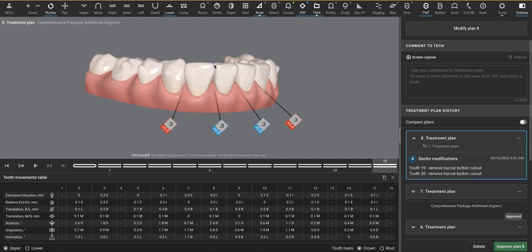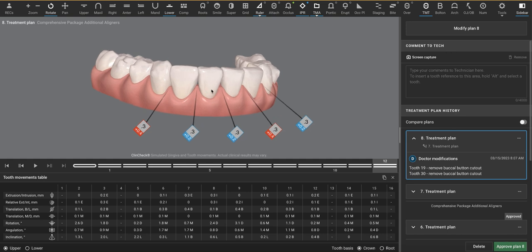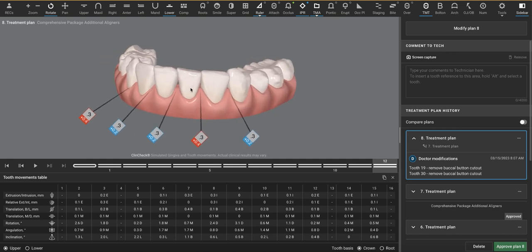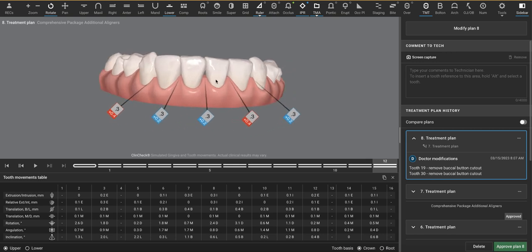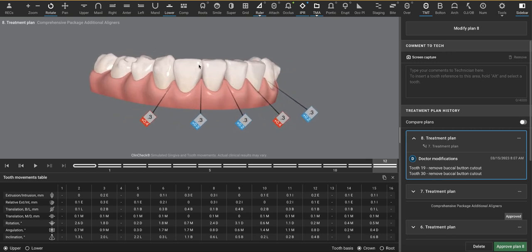See how much enamel you have here? Making this tooth look more square rather than triangular is actually a good thing aesthetically. So know when you see IPR that sometimes you want to take from both sides and sometimes you want to take from one side. To take from one side, you need one-sided IPR tools, and there's many tools out there. Keep that in mind as you do IPR. Don't be indiscriminate in the removal of enamel. And here I would focus it there.